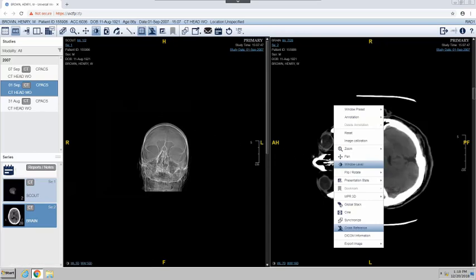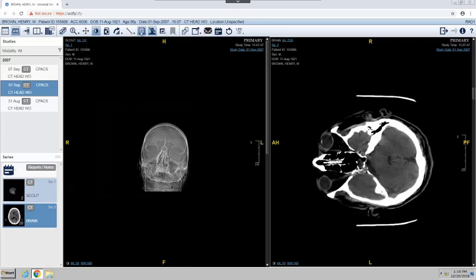The option to turn the image overlay on and off is located on the main toolbar. Clicking the button will cycle the overlay on and off. The tool for viewing reports and exam notes is also on the toolbar and will display these items if available.